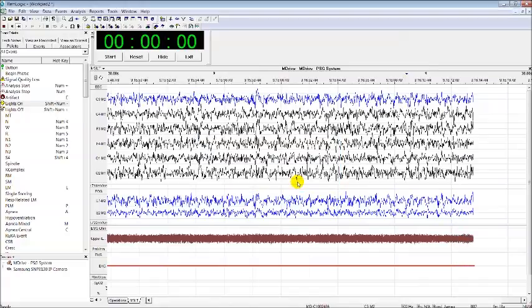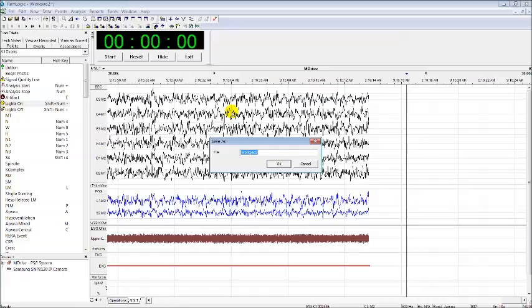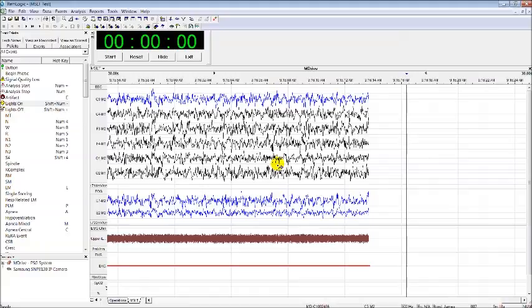And then do remember to save the workspace. That means the work that you have done here. So I just go to save, and I just put here MSLT test. Then I press OK, so that from here I know that all my work has been saved.